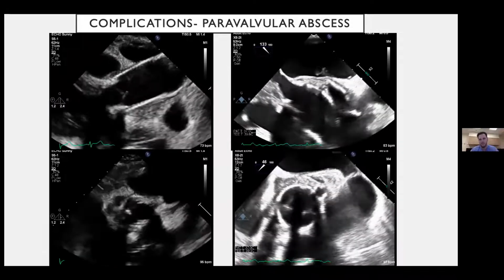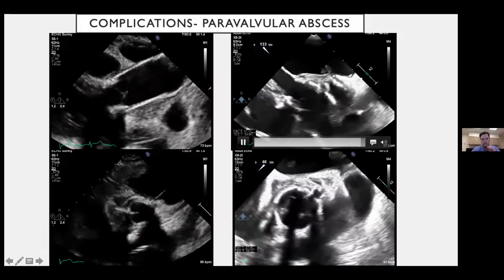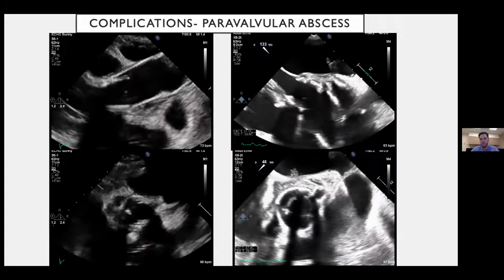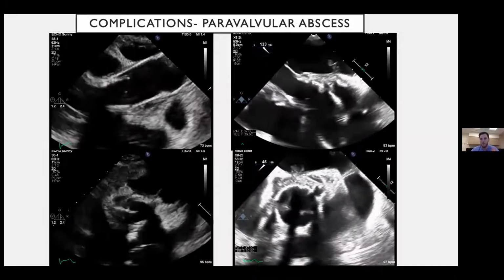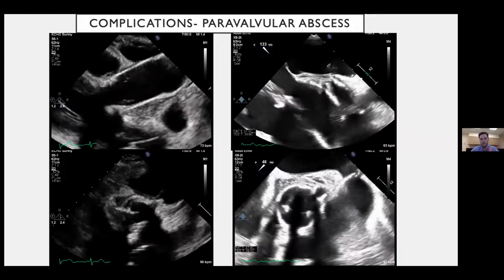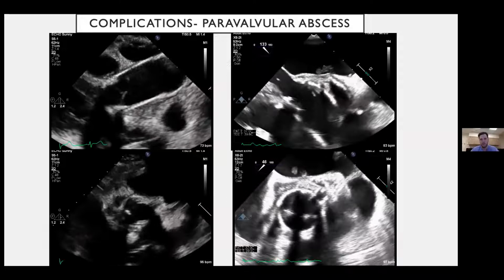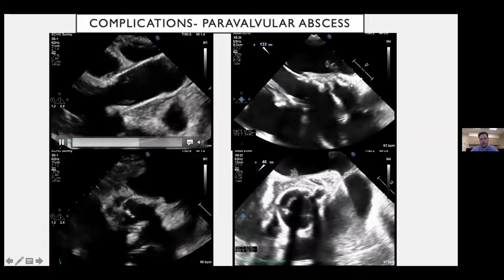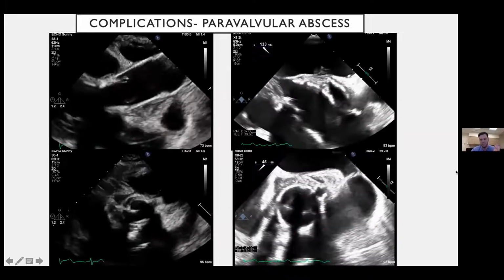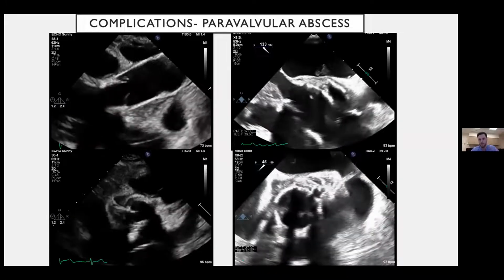And interestingly, I'm going to point out this little mobile guy right here. You can actually see that the infection extends into the left atrium. What we're seeing there is probably a vegetation or perhaps a vegetation-thrombus combination in the left atrium. So the infection is extending through the aortic root into the LA. The thickening also extends up the aortic graft, so consistent with perigraft abscess. So pretty striking findings for her. She definitely has a surgical indication, but unfortunately her surgical risk was quite high, and so the plan was for medical management for her up front.